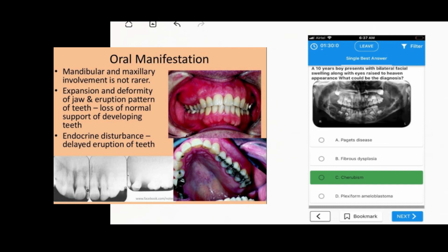So under the microscope, what you would see is vascular fibrous tissue with a variable number of multinucleated giant cells and scattered hemorrhage. These giant cells tend to be small and aggregate focally. Cherubism reveals eosinophilic cuff-like deposits surrounding the small blood vessels. So this eosinophilic cuffing appears to be specific for cherubism.